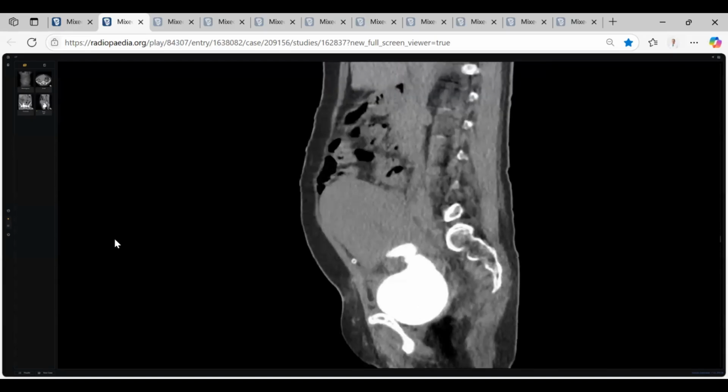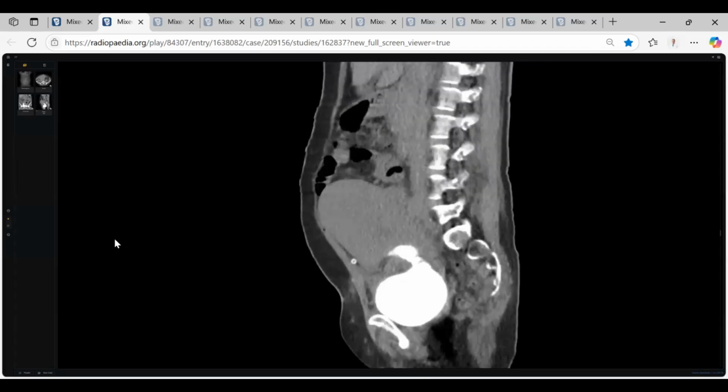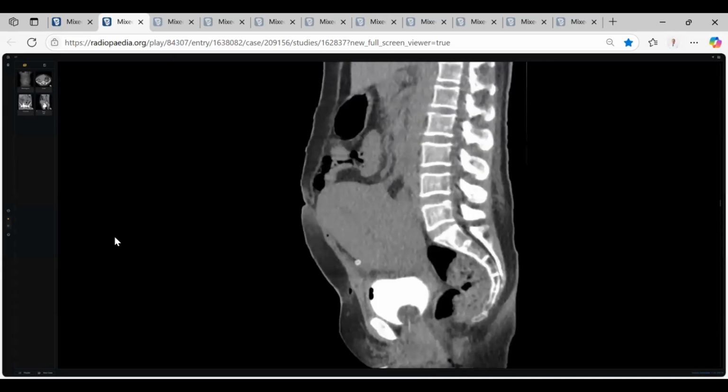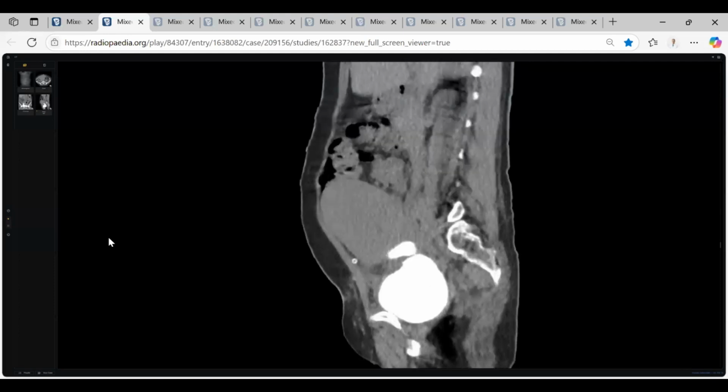Very common, either fistula tract or injury or rupture, whatever. But at least this is irregularity. It may be a contained rupture, because there is no spilling of the contrast outside this pouch. This is post-surgical, post-CS injury or rupture of the urinary bladder.